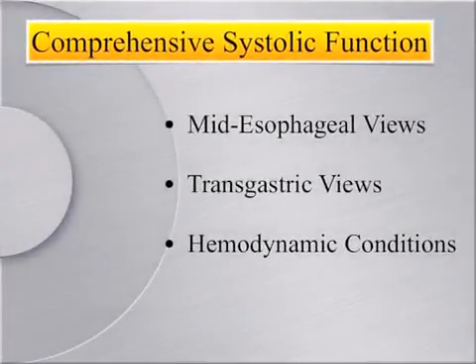Imaging planes for comprehensive systolic function assessment include mid-esophageal and transgastric views. Hemodynamic measurements for calculations can be obtained through Doppler imaging of deep transgastric or transgastric long axis views.